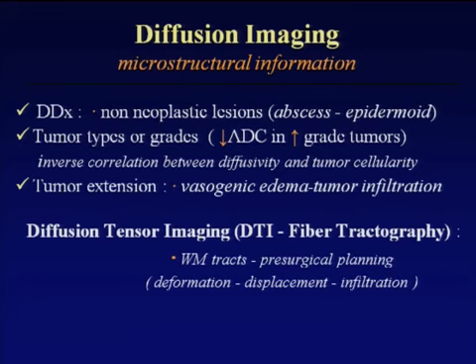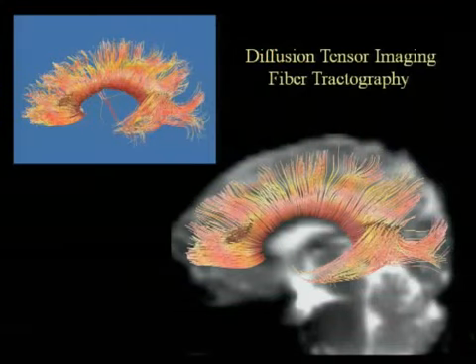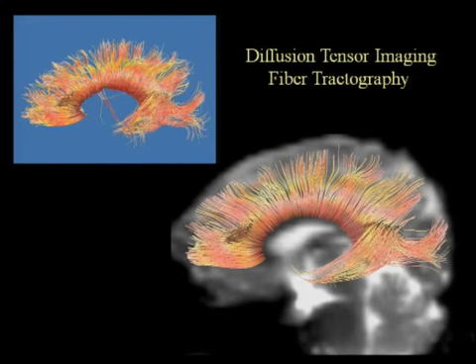And also we can evaluate with accuracy the tumor extension, and you can use diffusion tensor imaging to take these very fascinating images of fiber tractography. This is one of our residents in our department. He spent a lot of time there to take these normal images of corpus callosum. You can take fiber tractography and images like an art gallery. But this is very important.